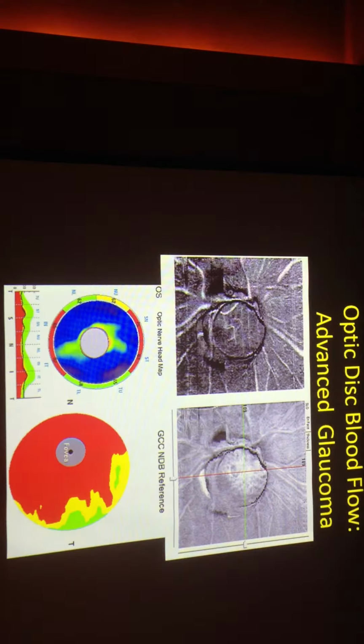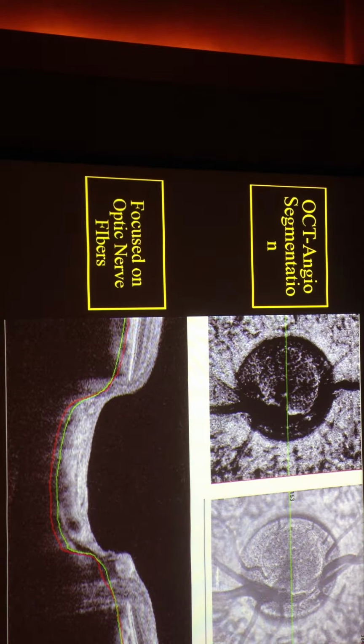As you can see on these images, segmentation is not very easy to obtain, and the same part with the same segmentation appears on the periphery of the disc and inside the disc. So with the tool we can use today, we have to choose. We make examination inside the disc or we make examination outside the disc. Probably in the future we will have segmentation that follows the contour of the optic nerve, but at this time it's not so easy to obtain the right segmentation.